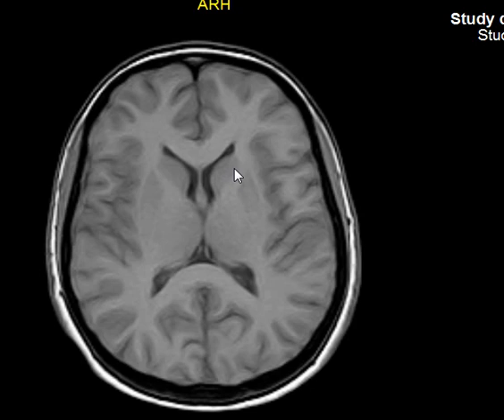In the brain, which one has more fat, the white matter or the gray matter? The white matter, because it has myelin. Myelin is fat. The white matter are nerve fibers. Nerve fibers are myelinated. Myelin contains fat. So the white matter will be brighter than the gray matter on the T1 weighted image. You can see here, right? This is the gray matter, the dark line here.